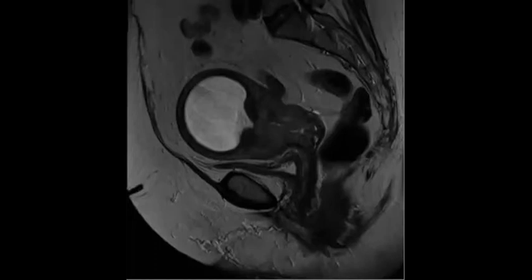So there is a mass, yes, high signal. If you consider the myometrial signal, it is high signal, and extending to the endocervical canal, sorry, and extending to the uterus. The canal is obstructed. Perfect. Endometrial widening or obstruction. I think you mean obstruction. Yes, the endometrial canal is obstructed.